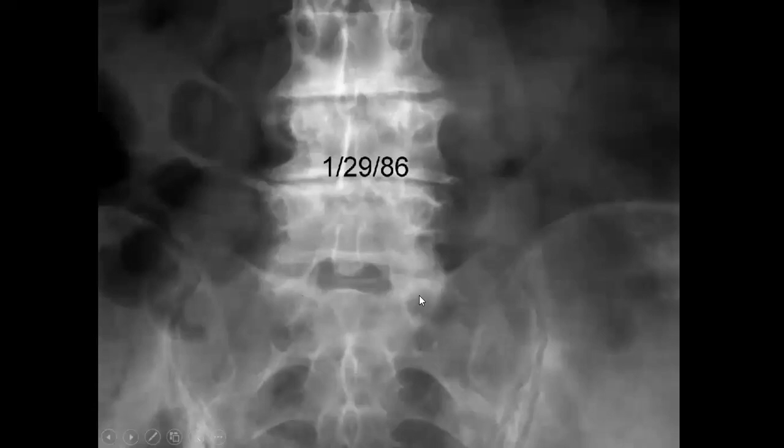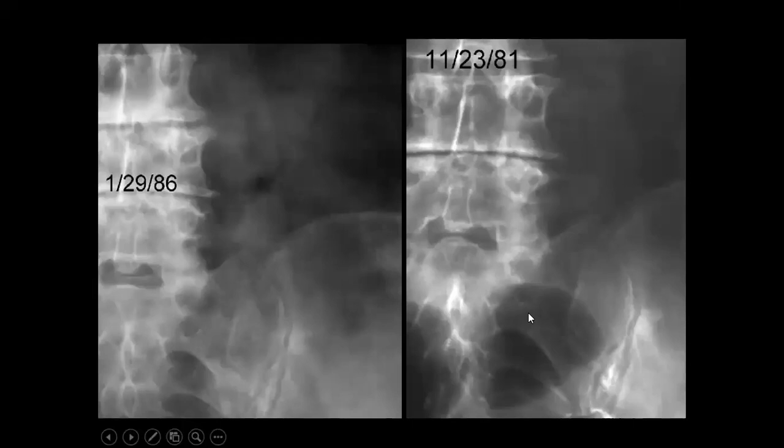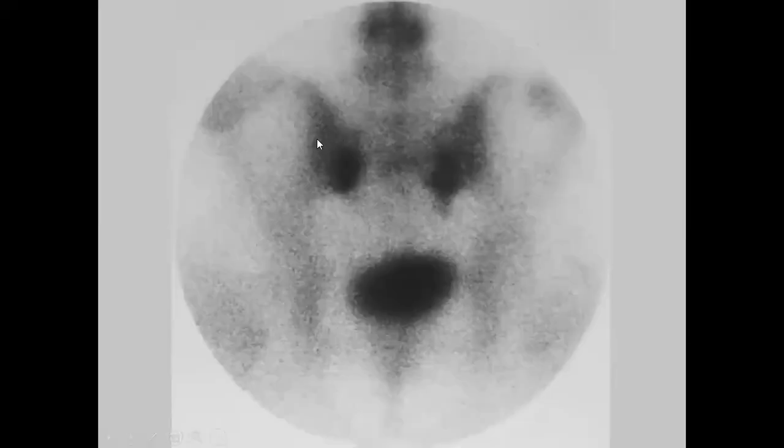Did this patient, for example, undergo something like radiation or any sort of stress or steroid intake, or an insufficiency fracture, which produces this, or a stress fracture, which shows you this Honda sign?